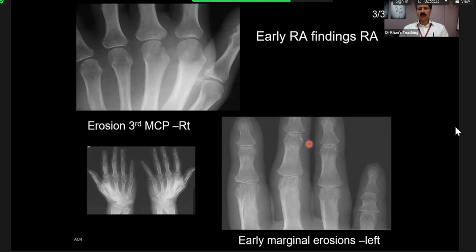You did very well where you picked up periarticular osteopenia, and your differential was rheumatoid arthritis. What other things will you consider? Candidate 1, can you answer that? I'd consider chronic reactive arthritis in the differentials, because in the early phases you can get osteopenia, and possibly SLE, although it's not very specific. I wouldn't really have any other differentials. Okay, excellent.